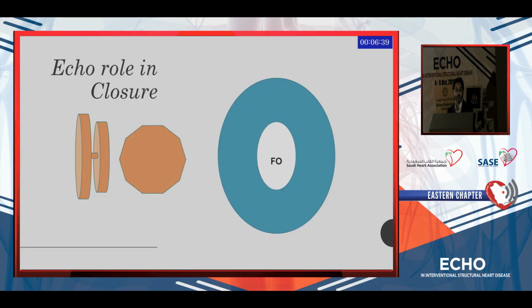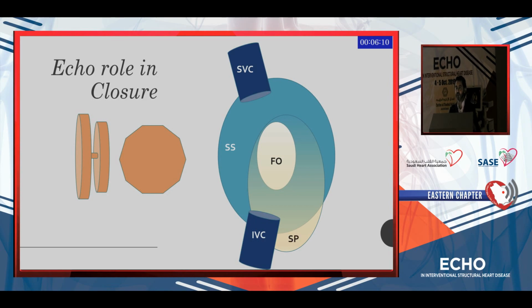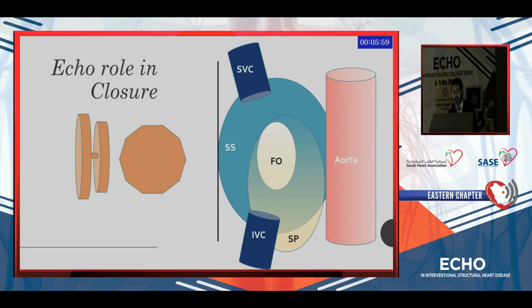Okay, so now we'll talk about echo role in closure. We have to understand that the PFO closure device is a 2-disc device connected with a thin membrane, usually a larger right atrial disc and a smaller left atrial disc. This is the fossa ovalis, and the blue thing is the septum secundum. It's the thick one. SVC is upward, IVC is inferior. And this is the septum primum, which is on the left side behind the septum secundum if you're looking from the RA perspective. Aorta is anterior, and you have here the posterior atrial wall.